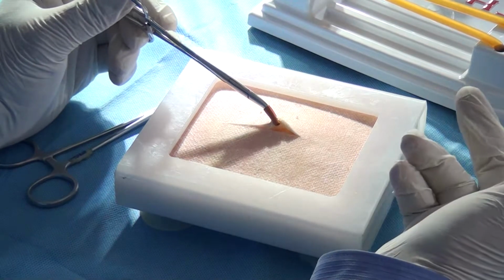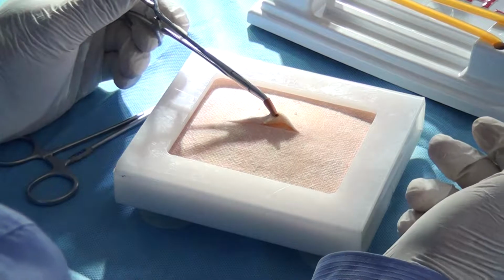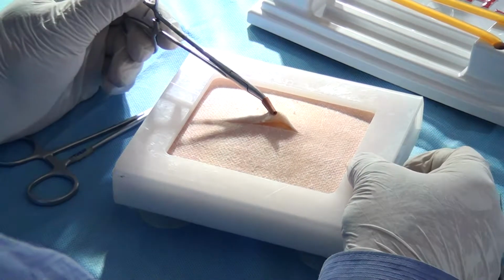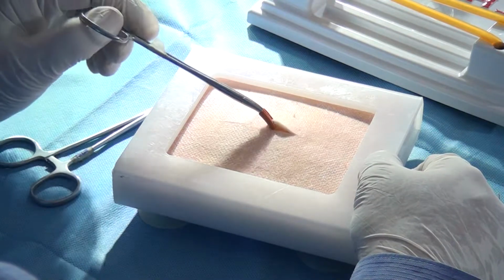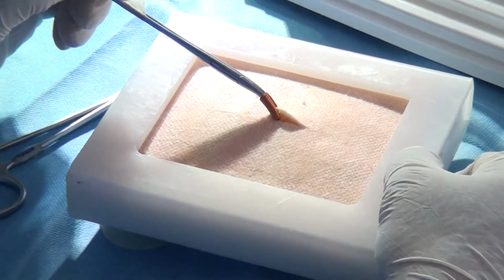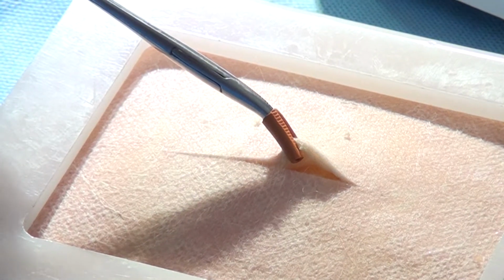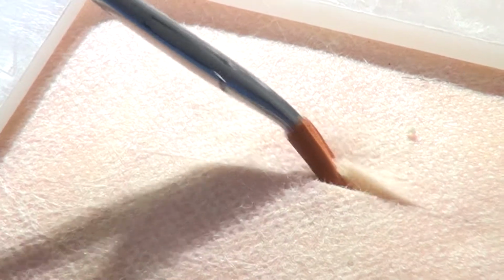The next question, obviously, I always ask the question. That's the way I teach. Then how about a she mosquito? The second answer was, after it has held the tissue, it looks like a mosquito sitting. And it does actually. Hats off to the guy. I said, I agree with you, I never thought that way. It does look like a mosquito trying to take the blood out of the body.